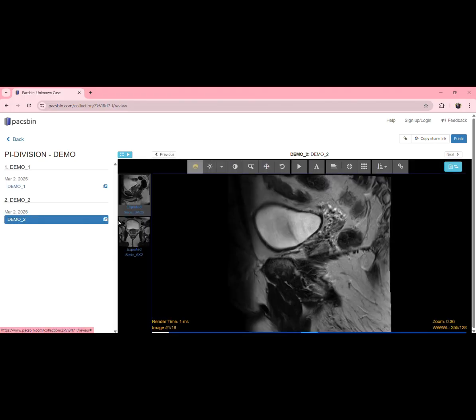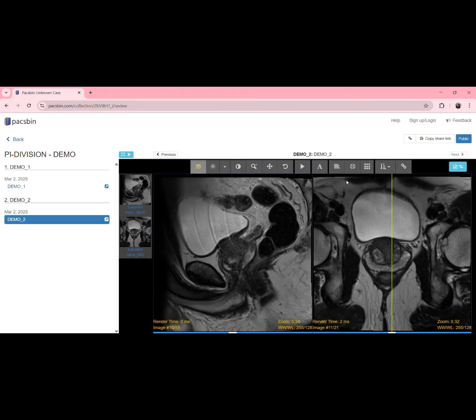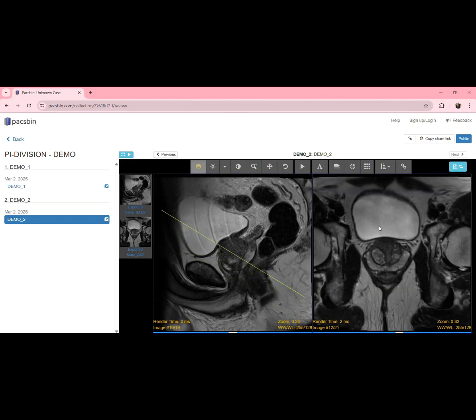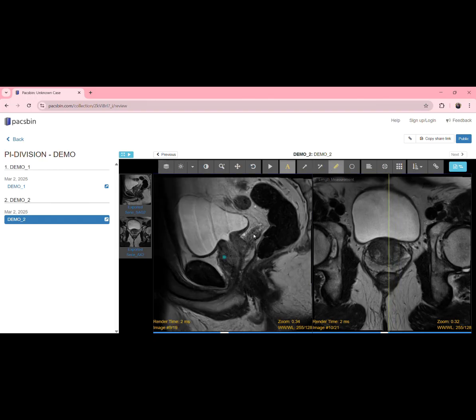Let's do it one more time just to check. You click on the case, you scroll, you split your screen in 2, you start your division. If you're not sure, you go back to scroll, you start drawing your lines. Please notice that the dots are in both axial and sagittal planes. You can scroll in the sagittal plane also to localize them.